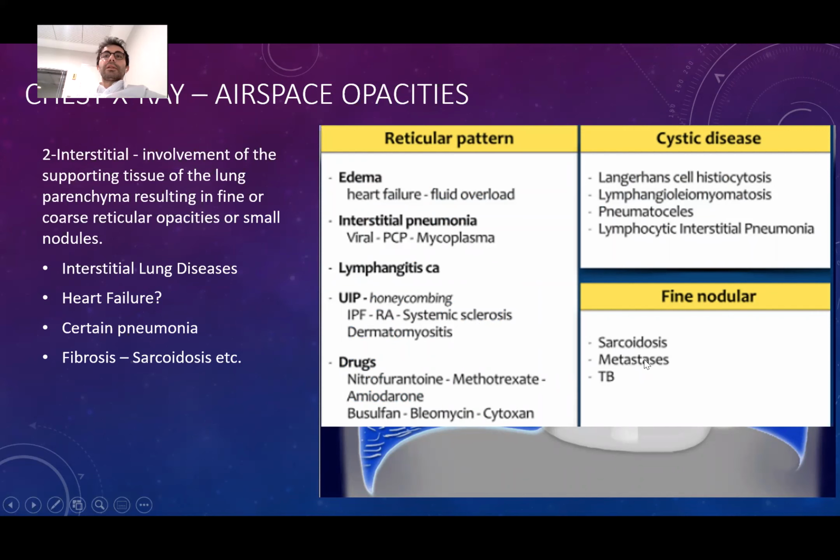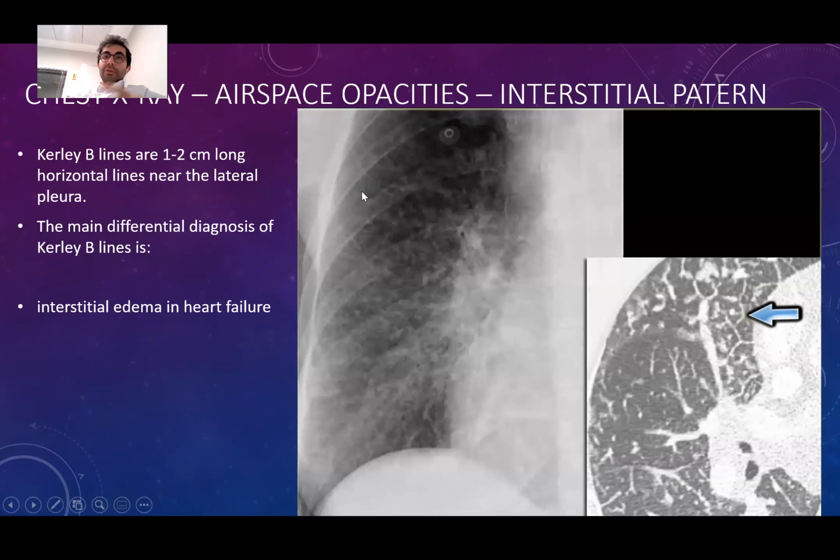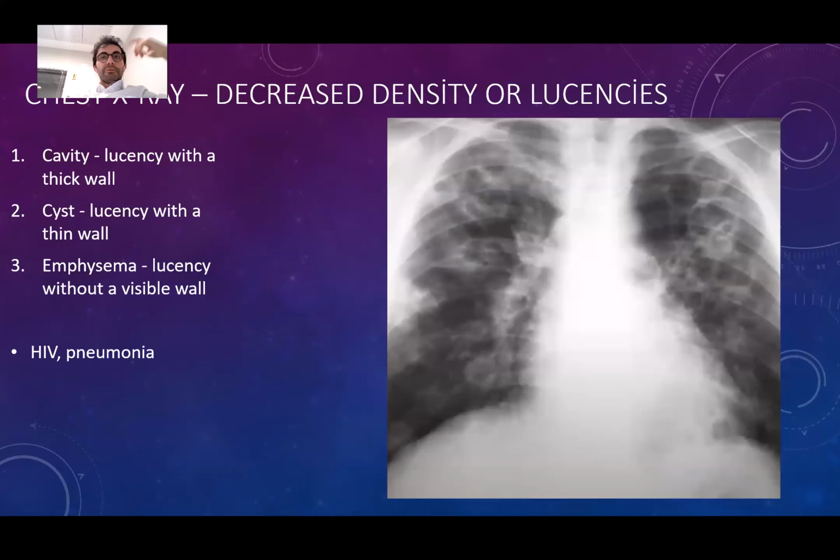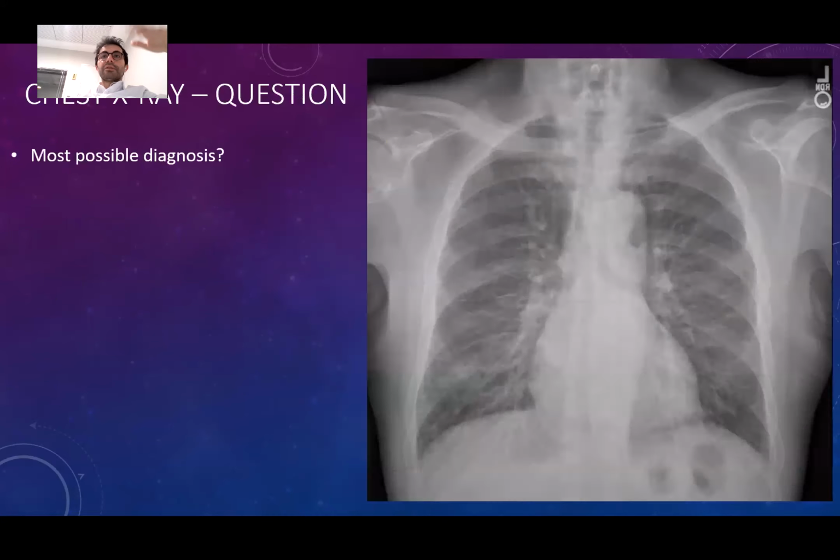Maybe this patient is in a sarcoidosis attack. We wouldn't know. But statistically speaking, it should be heart failure because it's more common and there are no other symptoms. Also, the heart is enlarged as well.